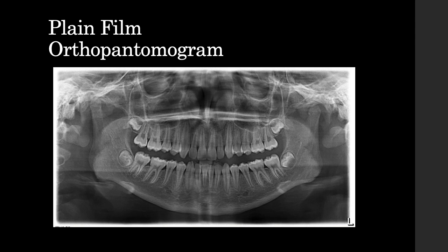Whereas here you can see that actually in the centre it's slightly blurred where the image is folded over, but at the angles and at the periphery of the mandible you actually get really, really clear, good detail. You can see all the teeth here, you can see this patient's bottom right wisdom tooth hasn't erupted yet, but in fact all their wisdom teeth haven't erupted yet.